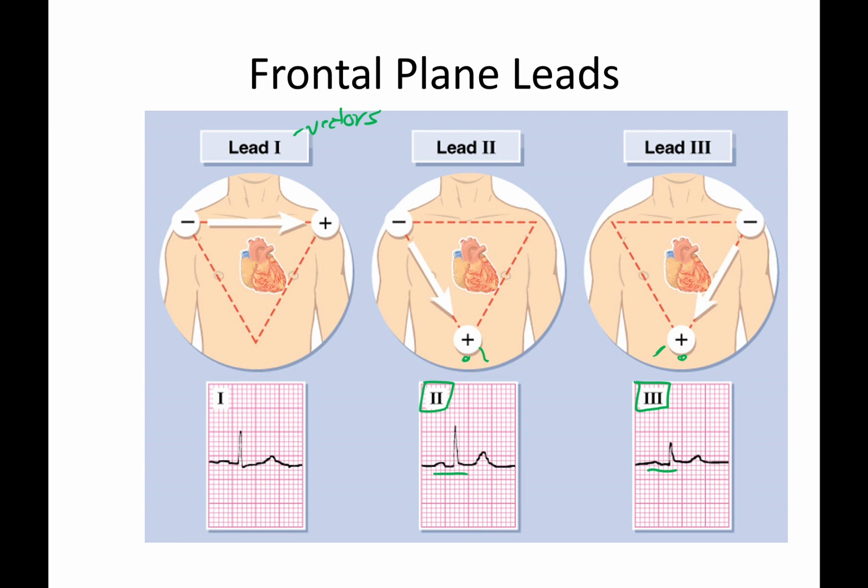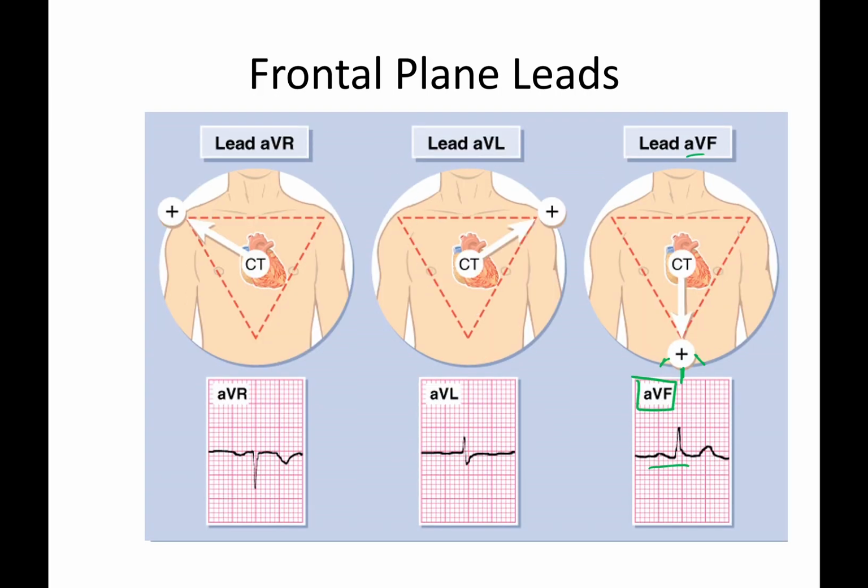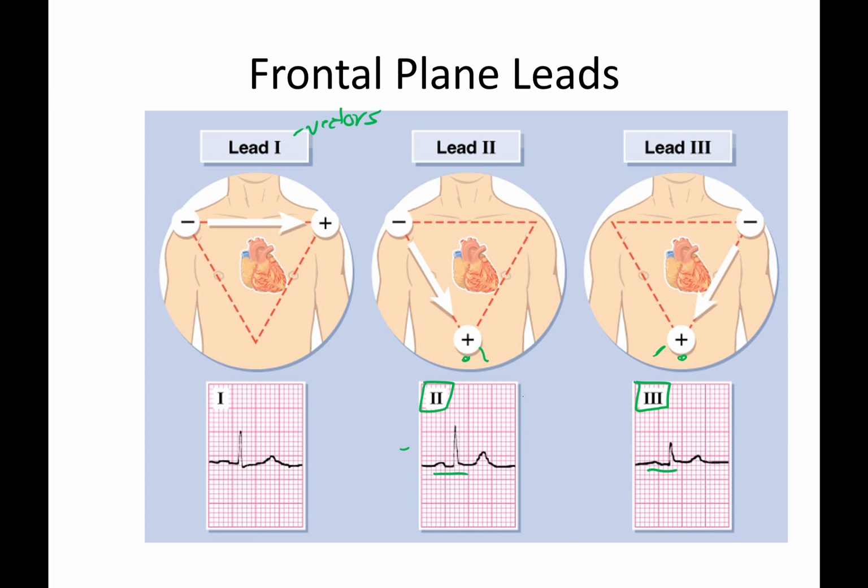Now, to really point out a contrast, think about your 2 lead right here. We're going to look at your AVR, which is flowing almost, if your 2 lead is going this way, your AVR is essentially heading the opposite direction. And it really is. Look at this. Inverted P wave, inverted T wave. It's the exact opposite of a 2. And it's for that reason that we don't really use the AVR all that often.